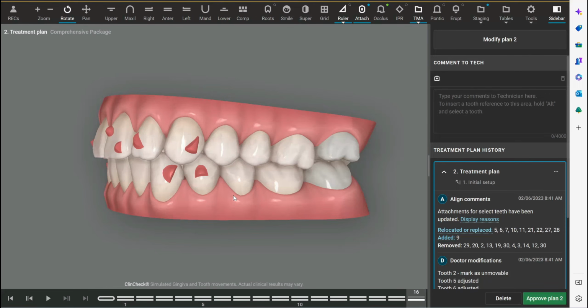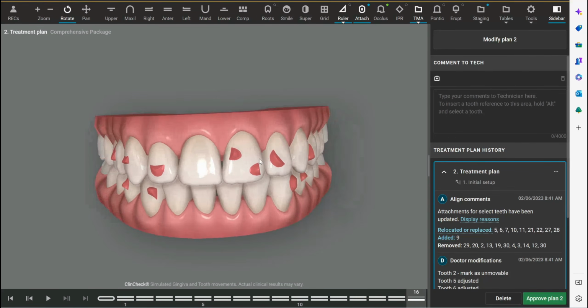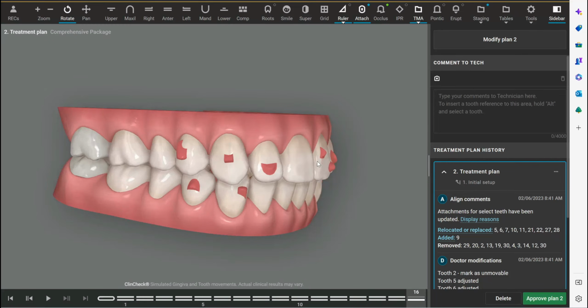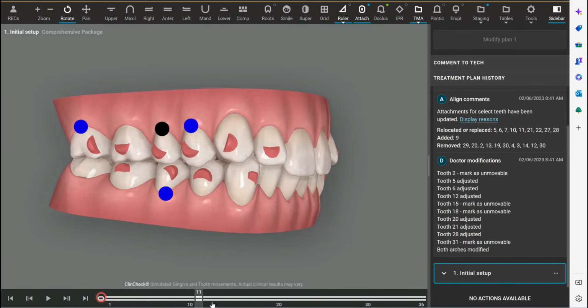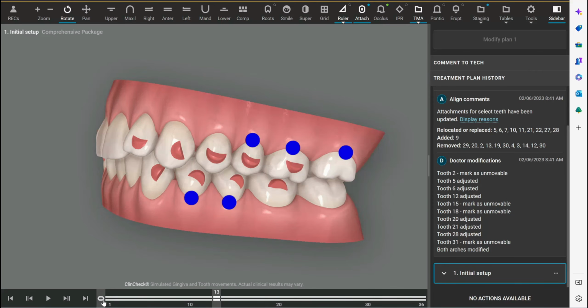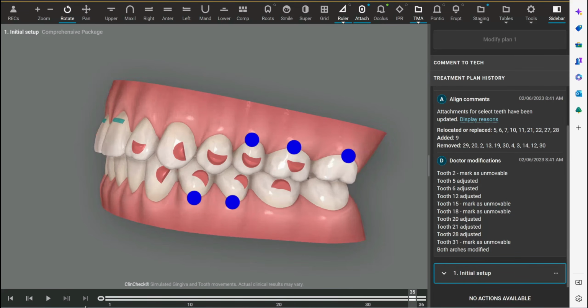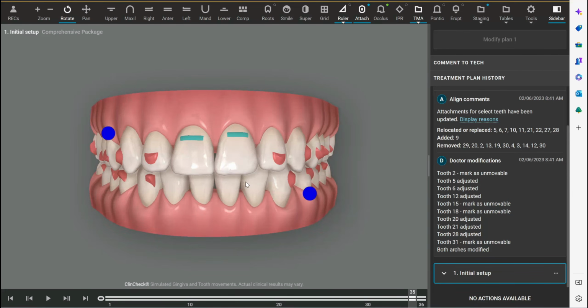So this case would have taken a lot longer if you didn't run live update and if you didn't simplify the movements. It would also take, probably, a really long refinement to finish this case because those movements that you saw in this treatment plan will not be expressed fully. And when that happens, the occlusion is really unsettled, and you need long refinements to correct the occlusion. You've got to try to move back teeth into the proper interocclusal relationships with their opposing teeth. So this would not have worked out. This case could have ended up with a compromised outcome with occlusion. And it only took 17.